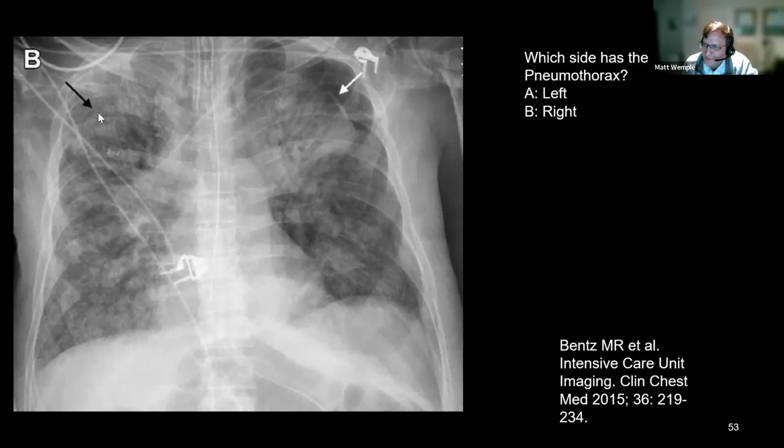Usually a skin fold, which is what we see here, will look like white, then a black line, and then white after it. So a black line in the middle, but there's still lung parenchyma behind, further beyond it. So white, black, white is skin fold. Whereas here you see dark, white, dark, and that's more suggestive of a pneumothorax.